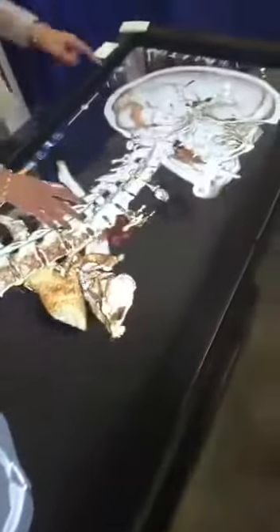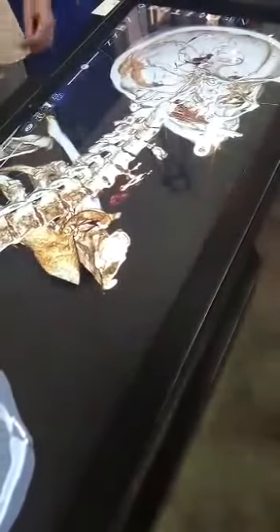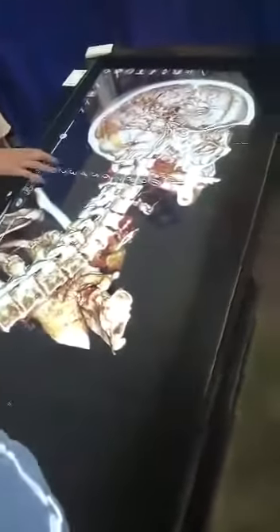And same functionality as before. You can go ahead and make a quick cut into the 3D model and see where the clips were placed as well. So it's kind of more intuitive when you see something in 3D where the clips were placed rather than just focusing on a CT. And then you can also add in some vasculature if needed. And you can also move it back down. There's other ways where you can utilize this where I bring in transparent soft and hard tissue. And so in this case, you still see where the clips were placed.